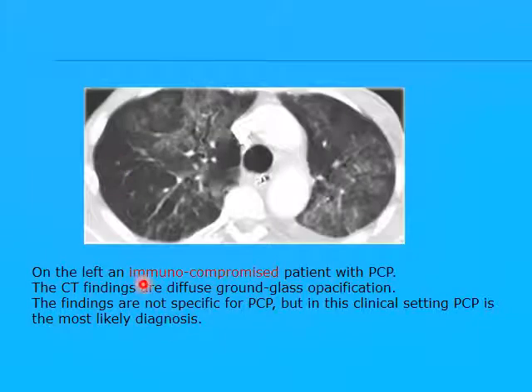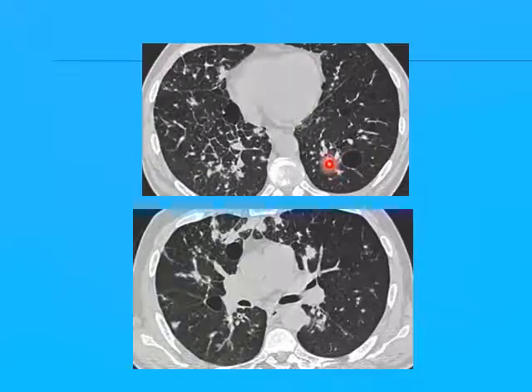This is the example. Immunocompromised patients presented by areas of ground glass opacities. Okay, sometimes pneumatoceles like this, nodules, scarring. If there is a history of AIDS or immunocompromised state, you can think of Pneumocystis carinii pneumonia. From this, as you see, clinical information is very important because imaging may have similarities in different diseases, but the clinical and laboratory data are mandatory to reach a correct diagnosis from these similar CT presentations.